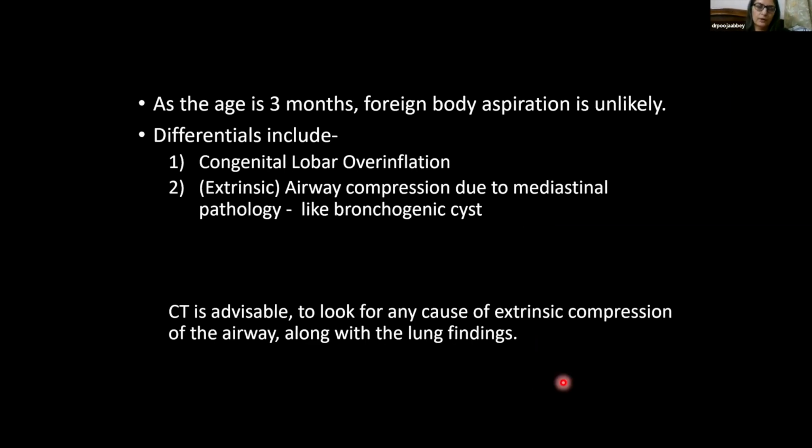So now the age, in this particular case, the age is 3 months. At 3 months, we won't think of foreign body because foreign body is usually at the age of 8, 9 months and above, up to 3 years. Typically, when children become mobile, they start crawling, then they will pick up these foreign bodies and ingest them. So at 3 months, foreign body is out. We have to think of some congenital condition. That is commonly what we would think of. So congenital lobar overinflation, that's one possibility.